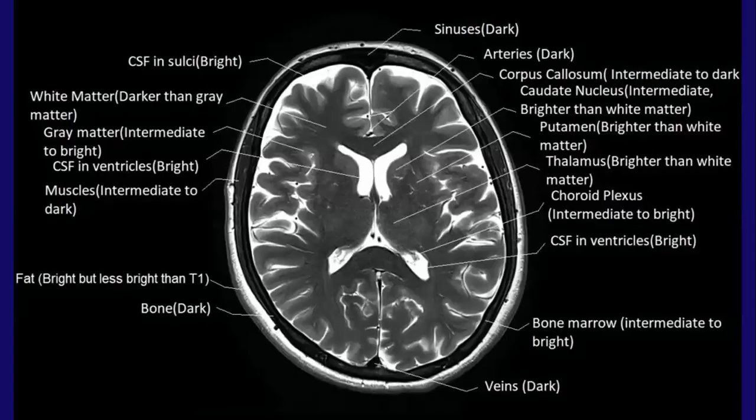White matter here, if you compare it, it looks dark, but compare the white matter and the gray matter. So here, the gray matter would be relatively brighter than the white matter because the white matter has more fat because of the myelin, and you would have it being darker relative to gray matter. So again, a lot of it is comparison. You're comparing it relative to a structure that is around it, and you're looking at it down the grayscale. Next slide, please.